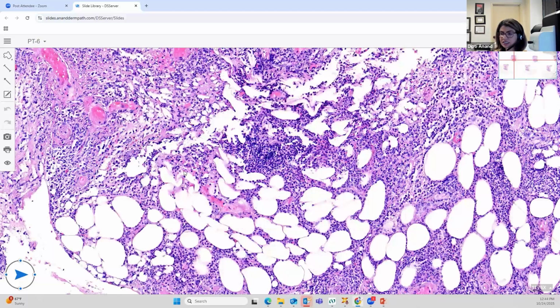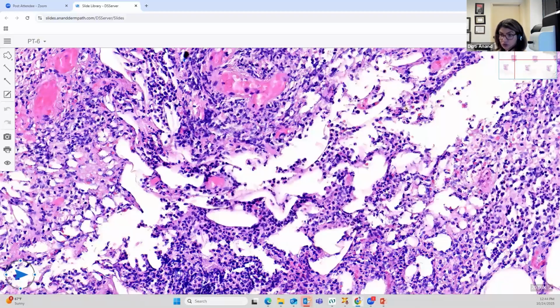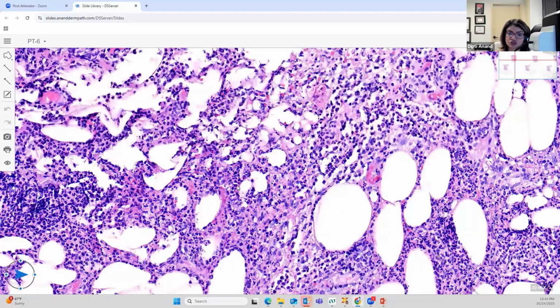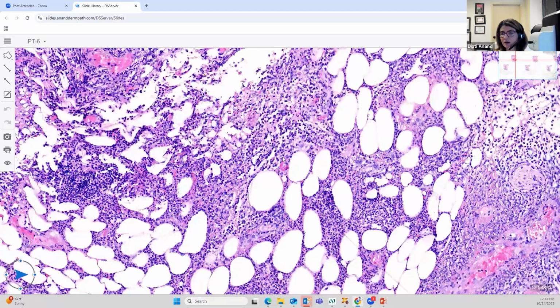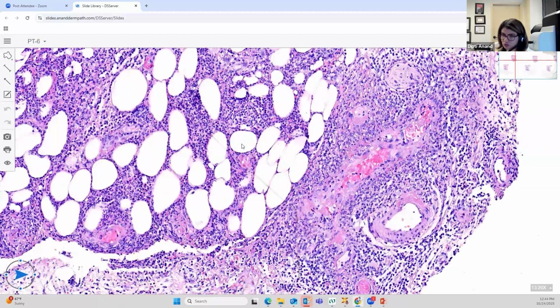erythema induratum. And the pattern of the fat necrosis in lobular panniculitis from erythema induratum is very dirty. So when you look at the pattern of the necrotic fat, it looks actually infectious because you will see neutrophils, you may see the dirty neutrophilic debris, the basophilic dust, the caseation necrosis. So it looks really, really infectious, like what we saw in your suppurative granulomatous dermatitis. When you think about an AFB infection, that's how the necrotic fat of erythema induratum will look like, except that you will have florid vasculitis associated with it.